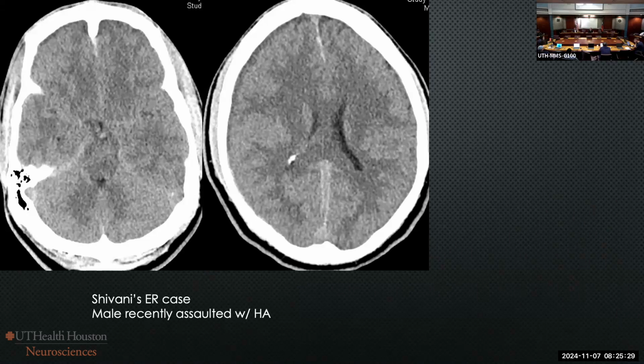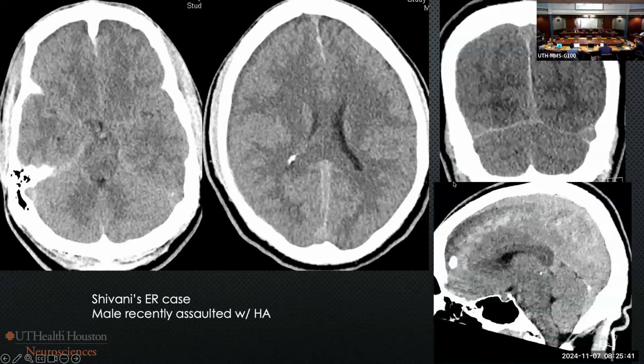Yeah, right? So one thing I could say about the imaging is that you do pick up the fact that this is another subdural collection. Why is it acute and that not? I mean, what's going on? So sometimes you can just do the simple thing of looking at their little reformations that they always make, right? The sagittal and coronals, and it helps you to understand what something is. So this was just a huge sagittal sinus.